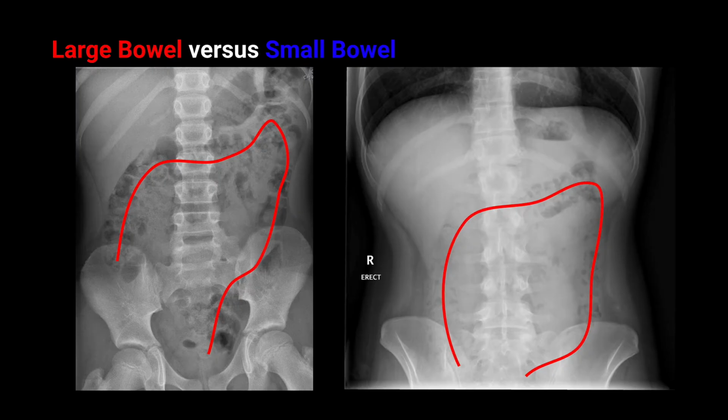Now, in terms of converting that down into the actual finding on the x-ray itself, people often find the large bowel very easily because it's usually in the expected positions. You can see they're outlined. And the issue more so is with finding small bowel. One thing I will point out on these large bowel images is that you can see in the splenic flexure on the left image that large bowel doesn't necessarily follow that picture frame or rectangular shape. And depending upon how much or little large bowel a person has, that large bowel can take a very tortuous or redundant course.